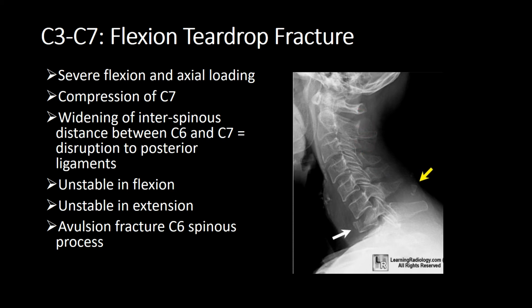Okay, so C is joints. Let's look at these intervertebral disc spaces. So we've got loss of the intervertebral disc space between C6 and C7. Got normal disc space there. Let's have a quick look at our facets. Facets are all normal. Okay.